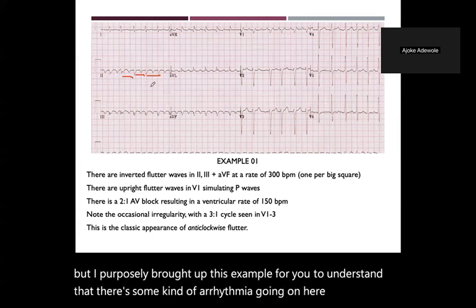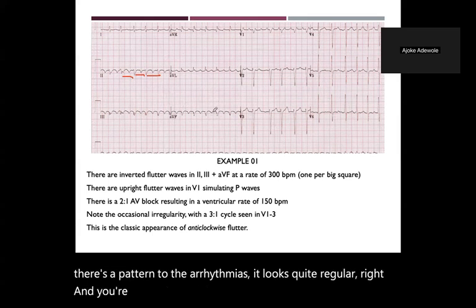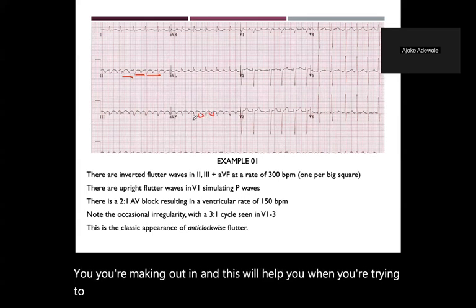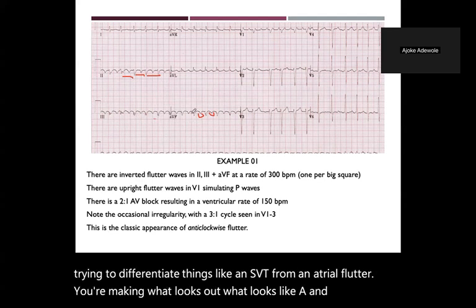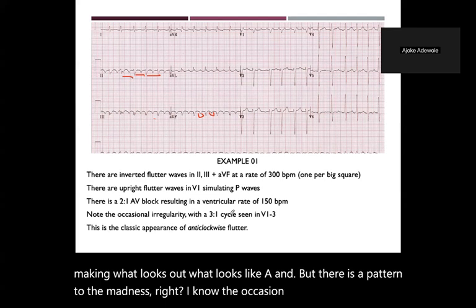But because there's a pattern to the arrhythmia, it still looks quite regular, right? And you're making out a bit of what looks like a P wave, right? This will help you when you're trying to differentiate things like an SVT from an atrial flutter. You're making out what looks like a P wave, but there is a pattern to the madness, right? And note the occasional irregularity.